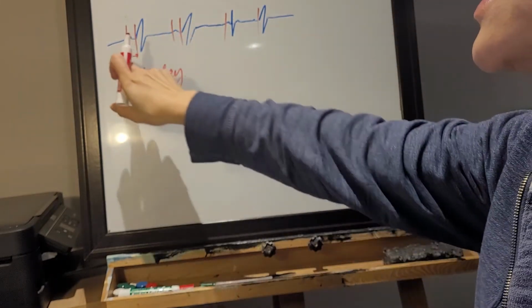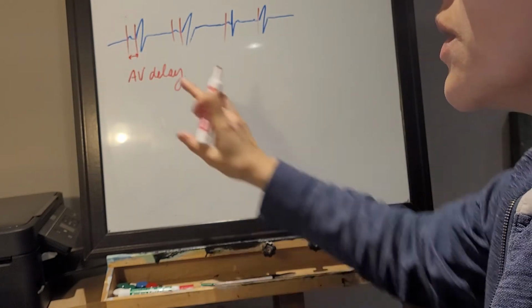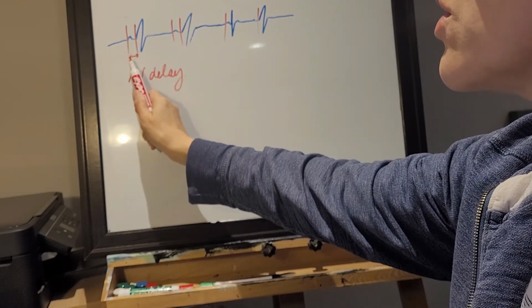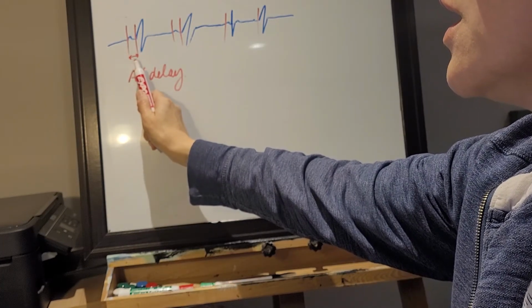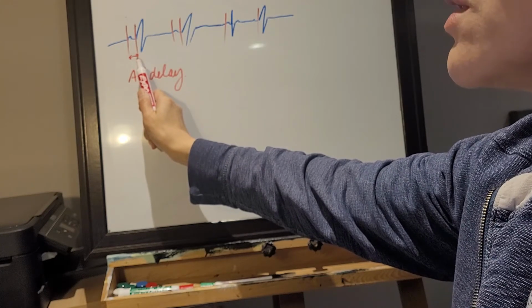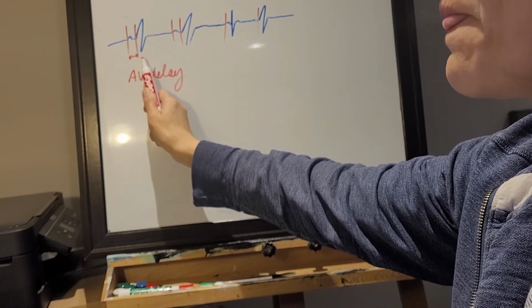So once the pacemaker fires for the atrium, it starts to count. The timing interval starts to go and it's looking. If it doesn't see intrinsic ventricular activity, it's set to fire. Good, it captures the ventricle.